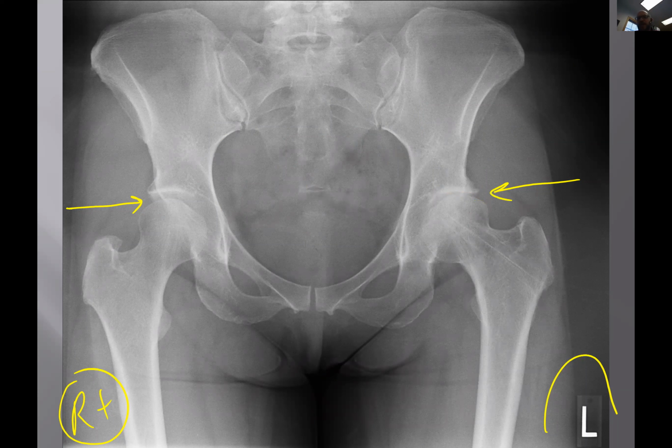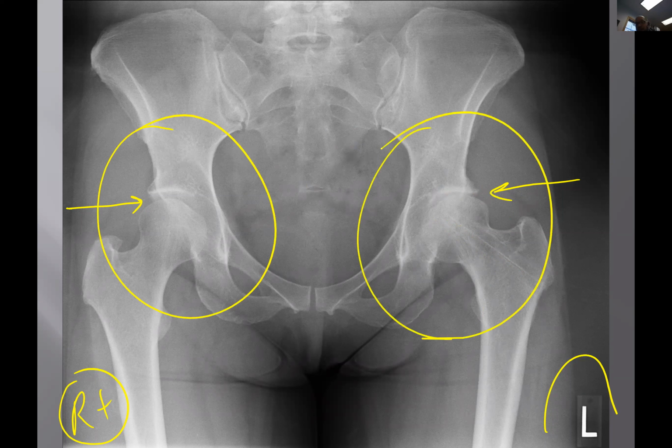But I bet you're looking at these lines here. Pinned. Been pinned. Yep, good. And so good job. This patient had previous intramedullary pins or rods or screws from an old fracture through here a long time ago. And so now we know why such a perfectly good hip here, but a bad hip here. Why?